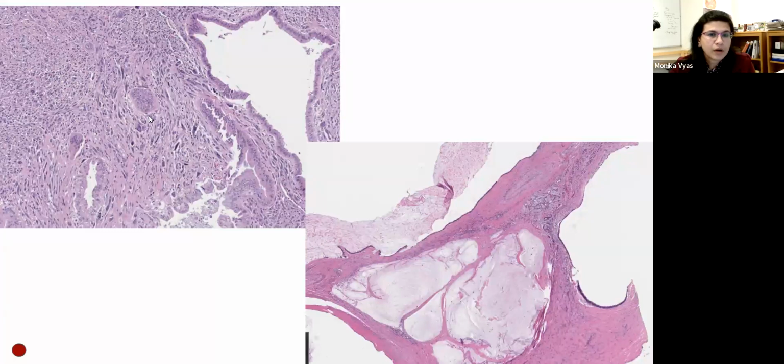And then you have multiple osteoclast-like giant cells. These tumors typically have a better prognosis than pancreatic ductal adenocarcinoma. So this is something to keep in mind, and a variant that should be mentioned at the time of diagnosis. And depending on the proportion of typical ductal carcinoma in the tumor, the prognosis may vary.